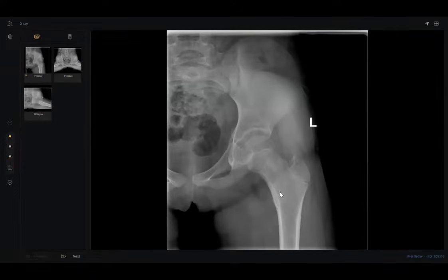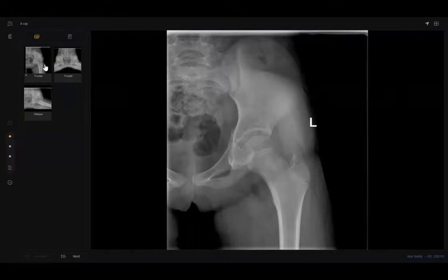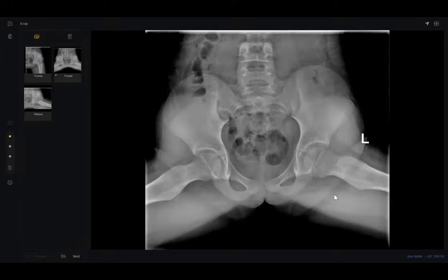What happened here? This is the abnormality here. There is thickening here. Second, what happened? You are worried about this greater trochanter, despite knowing that it may be a normal projection. Why? Because you put in your mind the history of playing basketball. But the examiner makes a trick here. The case answer is another pathway. So take care, my colleague. Take care from this.